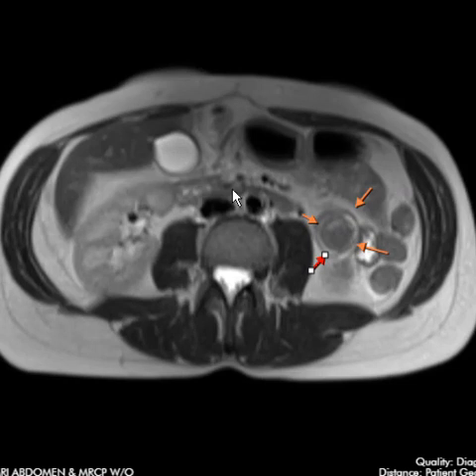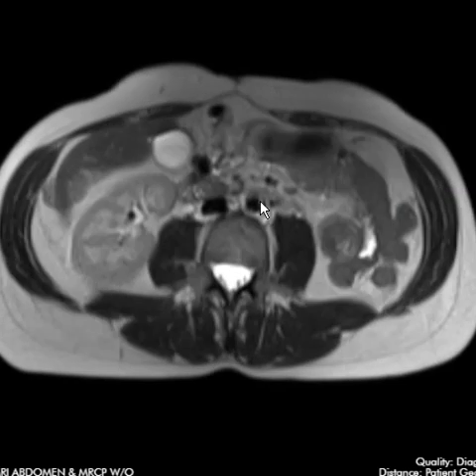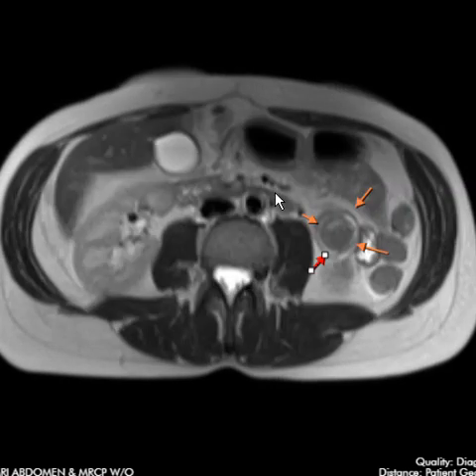Her proximal duodenum here is non-dilated, but now we're going to look at the SMA, because a low SMA angle can cause SMA syndrome, and it could cause the symptoms exactly like she described on the phone. And so this is the duodenum here coming through, goes across in front of the aorta. And here's the duodenum over here, and it looks really flat, like a little ribbon here. And we did some additional sagittal T2 images to check this SMA angle.